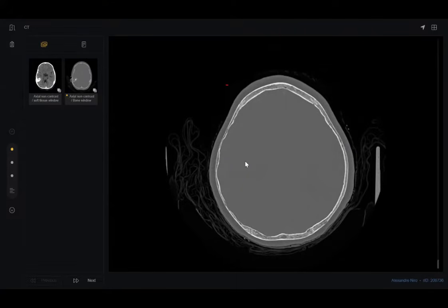So, sir, I would like to change my differentials. As this is a child, I think this could be a case of eosinophilic granuloma. It could be neuroblastoma mets, or even sarcoma with bony mets, because these three are most common, and I would like to place eosinophilic granuloma or LCH on top. There might be some soft tissue component, but I'm still confused about the fat level.